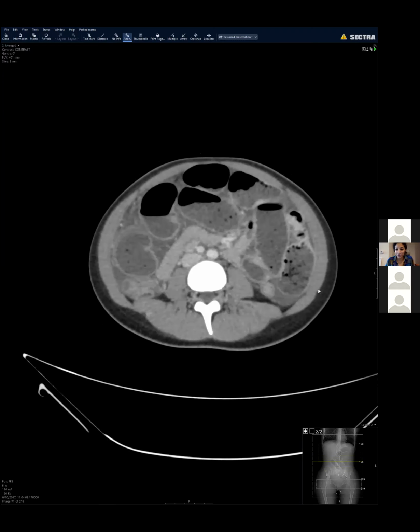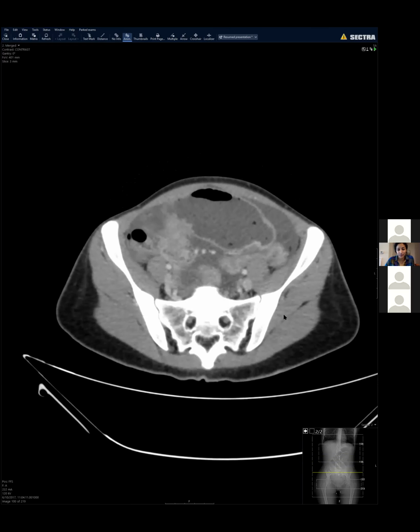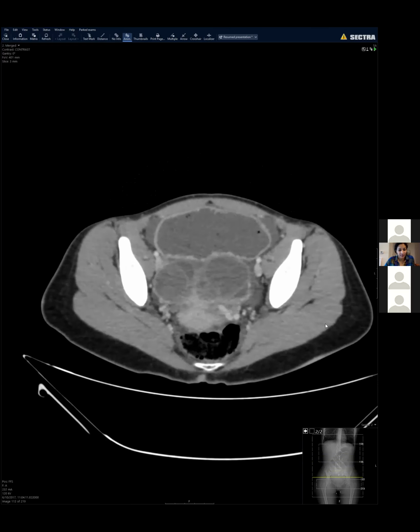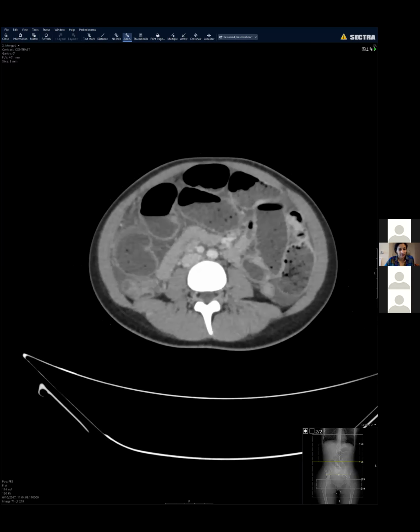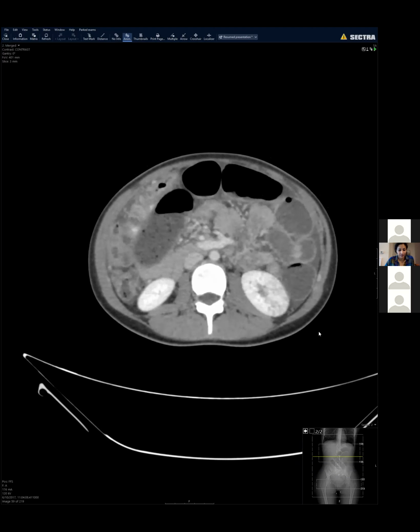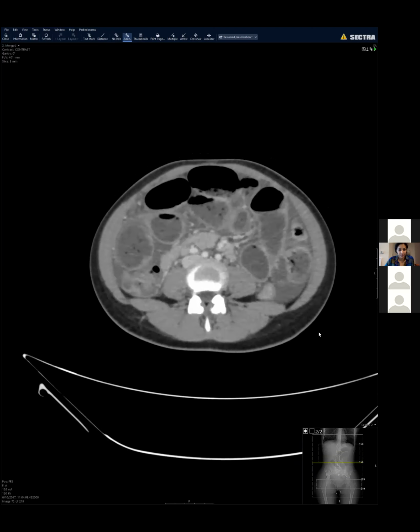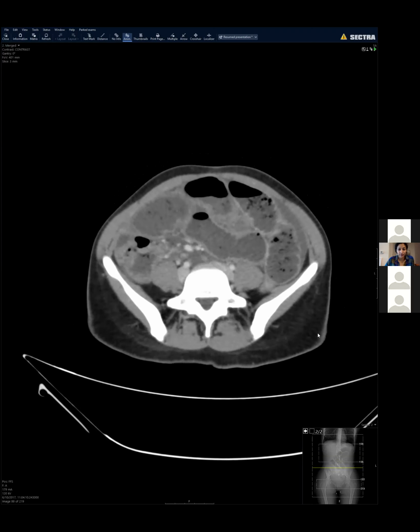Roopa, so we also have guesses of METs. So METs to the ovary, Krukenberg METs to the ovary from possibly a small bowel mass. Okay, so all good thoughts. Didn't find any, at least in the imaged part of the abdomen pelvis, things we would look for as sources of Krukenberg would be mucinous tumors, primarily appendix, sometimes the colon. The appendix in this case looked okay.